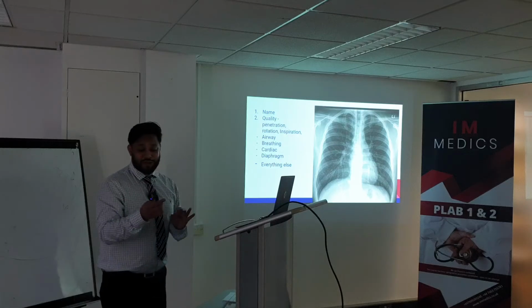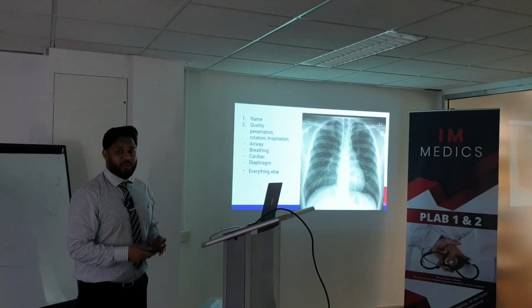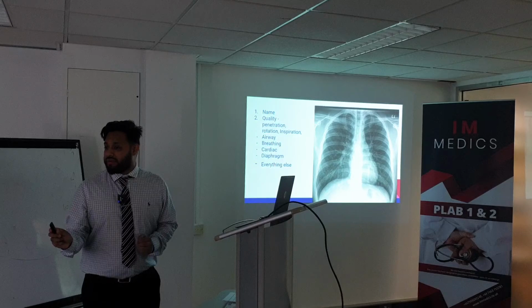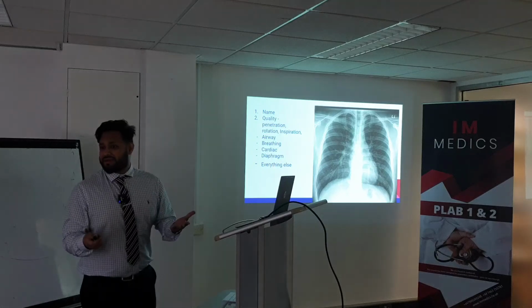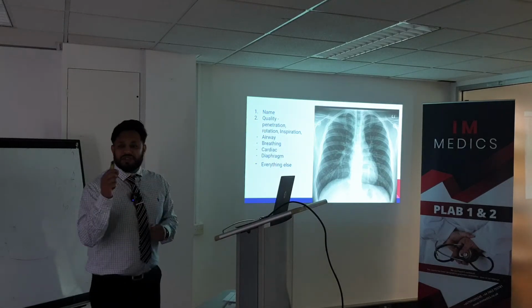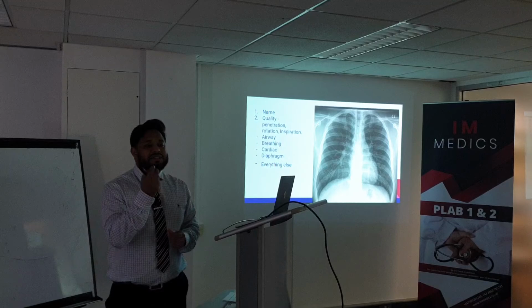First thing, basic, yeah? I'll think of it like a student. Black, what color should this be? Black. Air is black. White means some kind of liquid, a very white mass. Now, if you see white, look at the structure. Remember, he said demarcated. He used big words. Let's break it down. How does it look?